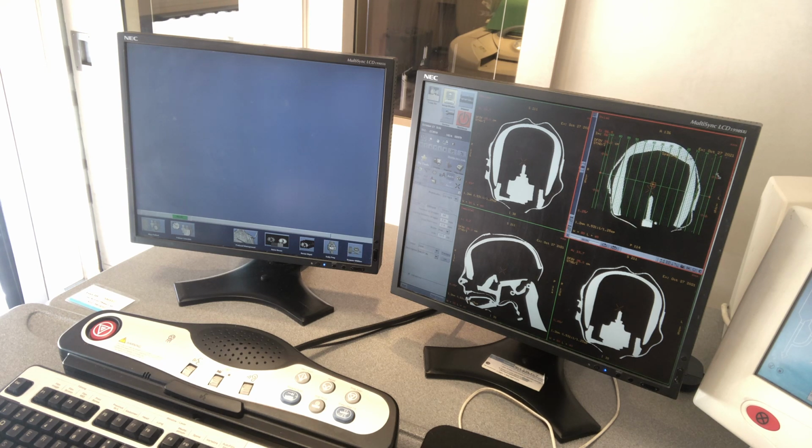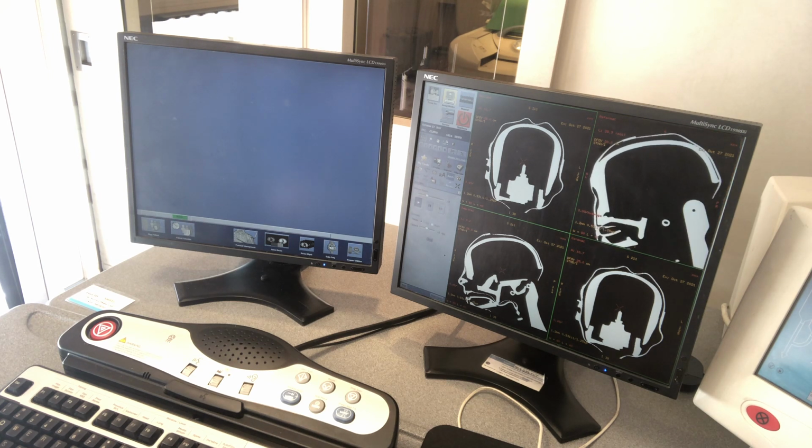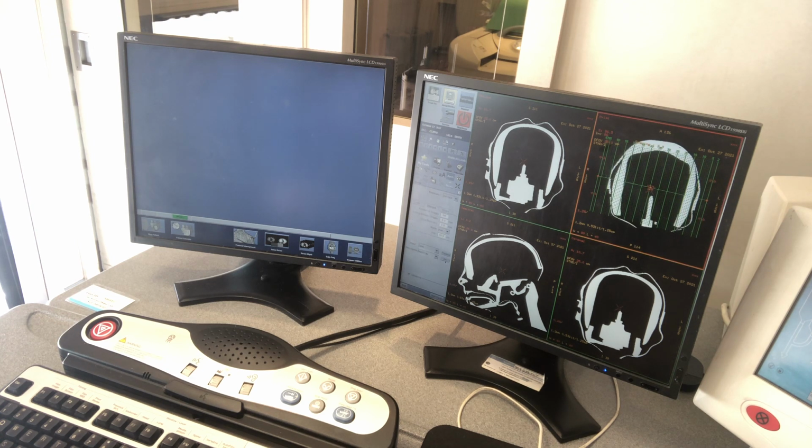And you can adjust with the arrows from side to side. You can pull more or you can take it in less. Once you get everything set there, you're going to preview it again. And then you'll hit OK.